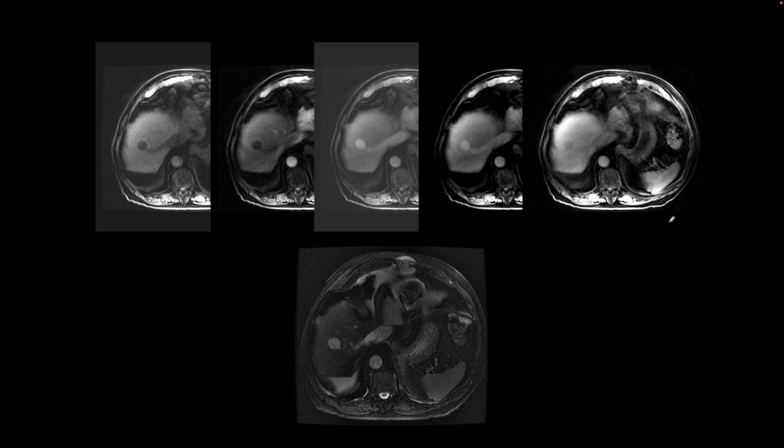Here is an interesting finding. So frequently we learn the different enhancement characteristics of liver tumors on contrast enhanced studies in terms of enhancement and washout and things like that. And so if we look at this lesion here, which is shown on the MR, this is without contrast. I would call it C0. This is the arterial phase, portal venous phase, and delayed phase, and more delayed phase.